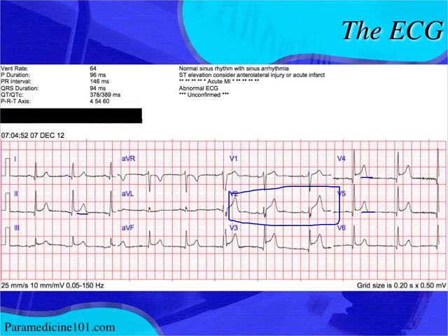Over here in lead 2, I see some in the inferior leads. There is some in lead 3. You have to take that into account because that also has a small QRS complex, and aVF. So in the sense of acute pericarditis, we've said before that it's global. It doesn't have to be in every single lead. A lot of times V1 will actually have ST depression, but you do have ST elevation in a lot of leads that don't really go along with each other.